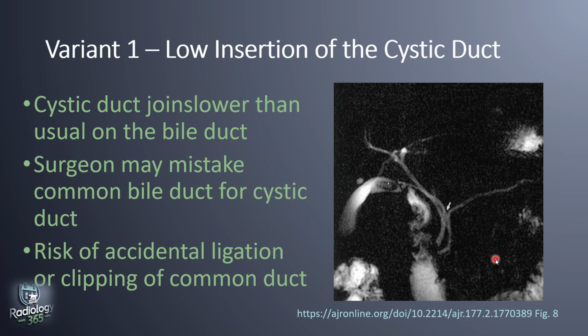So this image shows the common biliary variant in a 45-year-old woman with cholelithiasis, and it's a projectional MR cholangiogram which shows medial and low insertion of the cystic duct. So if we follow the cystic duct, it goes all the way to insert very low here. This is the common hepatic duct. Ideally, the cystic duct should have joined somewhere up here, but then it went all the way down, and instead of joining it laterally, it inserts medially here, as shown by the arrow. Very low insertion of the cystic duct.